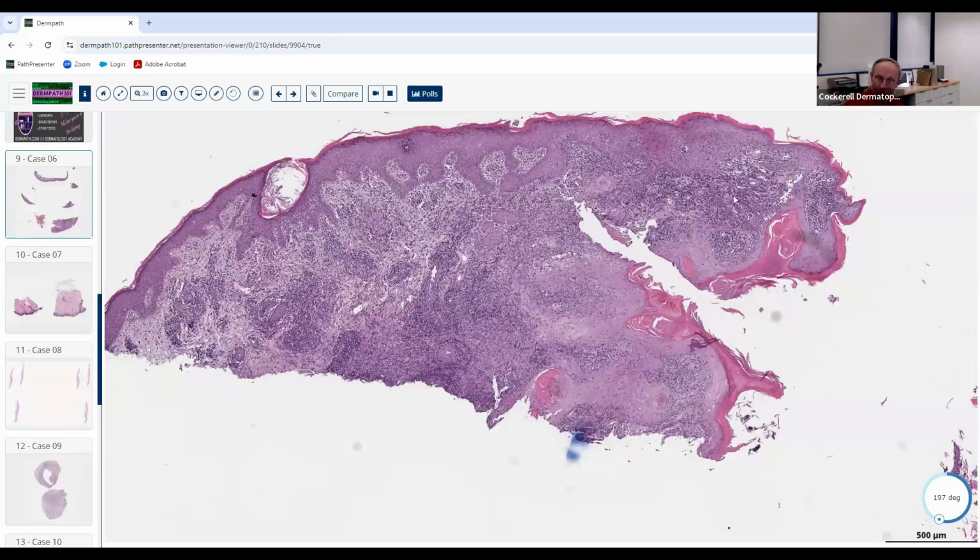Can you subtype and tell us a little more about what kind of inflammation is in these nodular aggregations? It looked like a lot of mixed inflammation. When we say mixed, what's in the mixture? I saw lymphocytes and some plasma cells, good, and then some histiocytes is mostly what I saw.